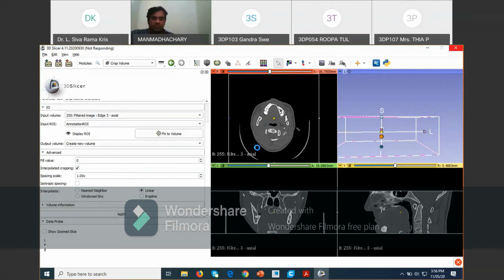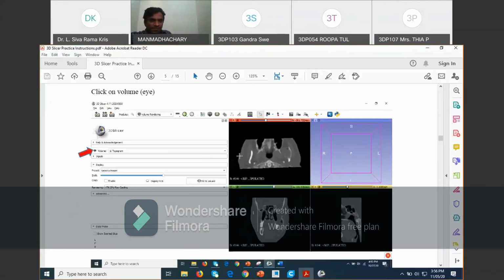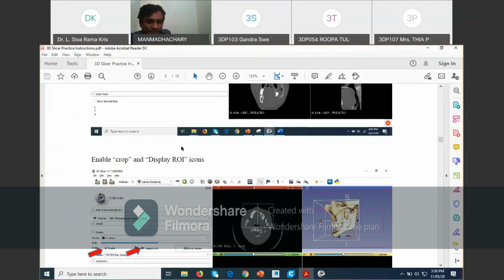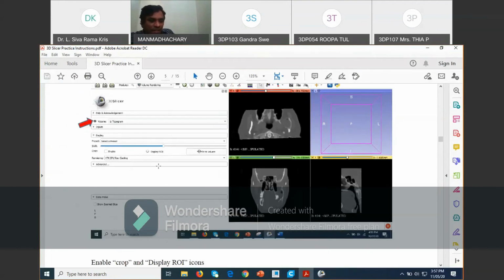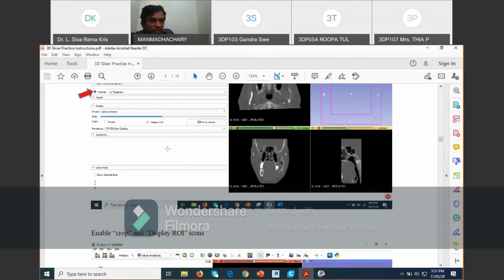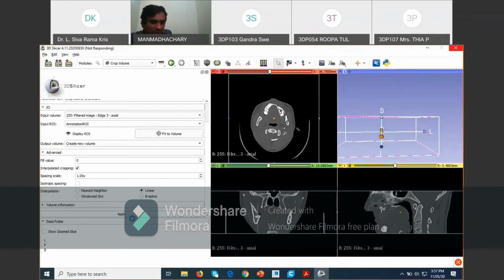Sir, in my portion I am able to get this one. Advance, I've got there. I've got linear also, but after that I have got data prop. Then you can see the apply also, madam. You can see apply here.